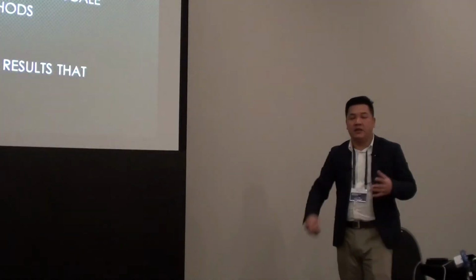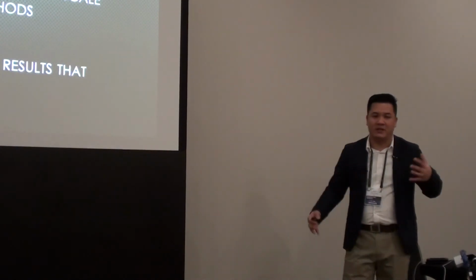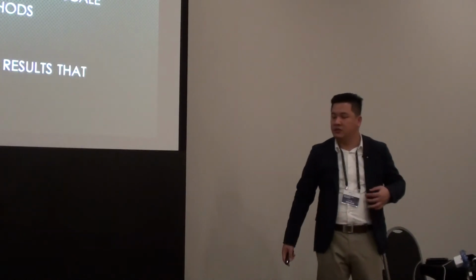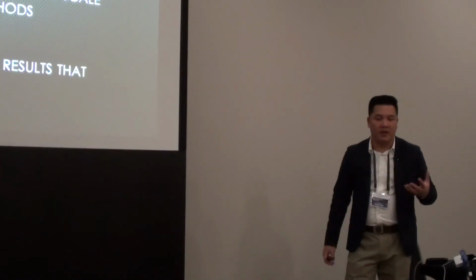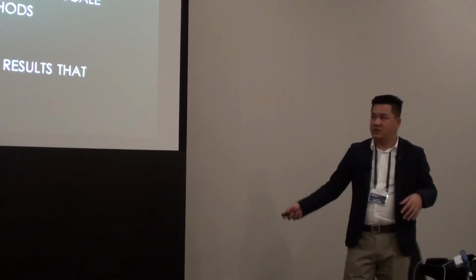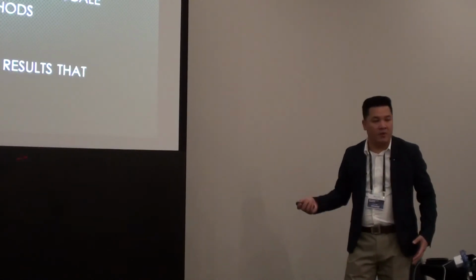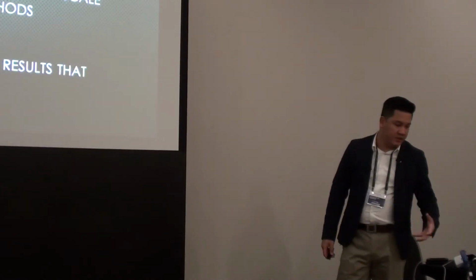So I'm going to shift gears a little bit and move on to digital dentures. That's one of my latest initiatives, really to ramp up digital dentures. Number one, because setting up a digital denture is much better than doing it by hand, in my opinion. You can choose from bilaterally balanced occlusion, lingualized occlusion, and it's set up and you can focus on it and you don't have to worry about waxing it up. So there's lots of benefits to doing them digitally.